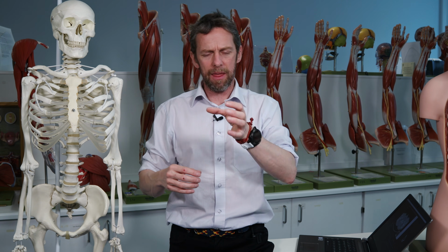What's that longer shape there? What's this here? That's the vertebra, and so on. It's just making you work, it helps you retain that information. You're working these things out. Also, of course, if you have to work with radiological images, this is a bit of a primer and gives you a head start.